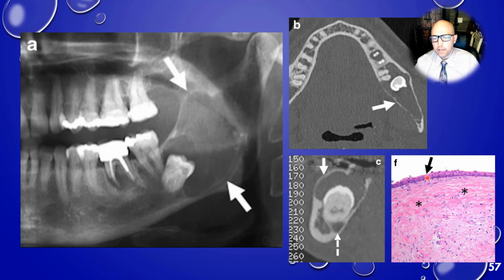And this is just a thin epithelial lining, nothing very distinct about it. Maybe a little bit of inflammation. But this is just a dentigerous cyst. So maybe I would have had, based on the radiographic appearance, first I would have thought OKC. But you have to notice, attachment around the crown of this tooth, and definitely have dentigerous cyst on your differential.